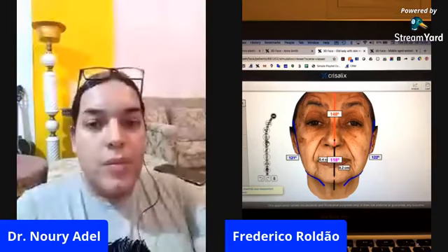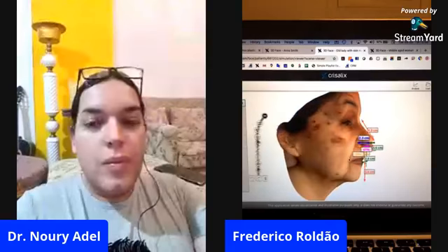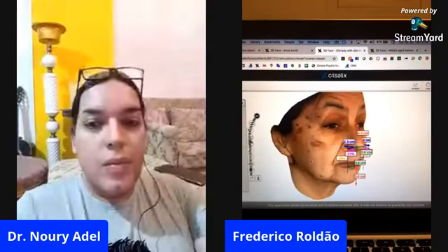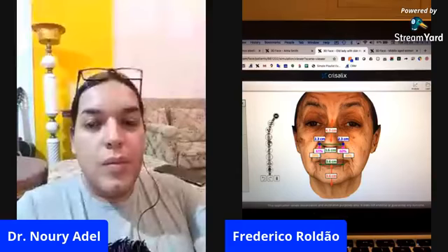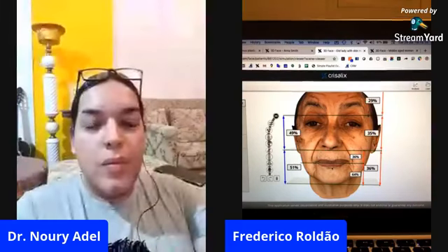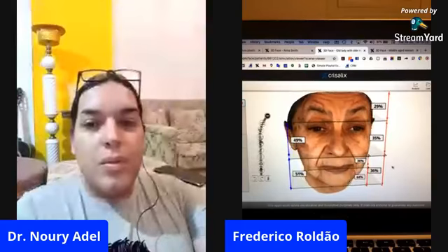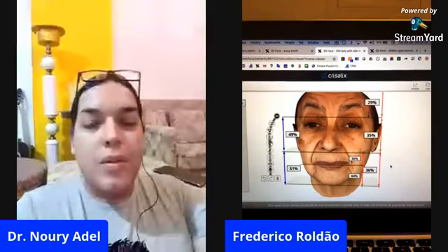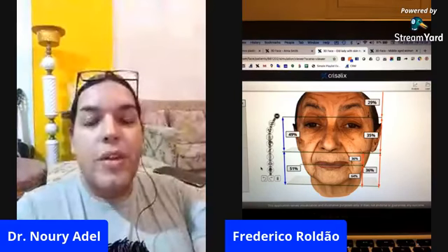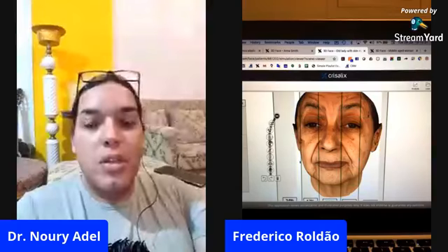Yeah. So besides the angles, we also have some specific measurements for the nose and mouth areas. But what you were referring to right now are the proportions, which are very helpful. Here we go. We have the proportions here, the thirds, and the fifths, the rule of fifths.